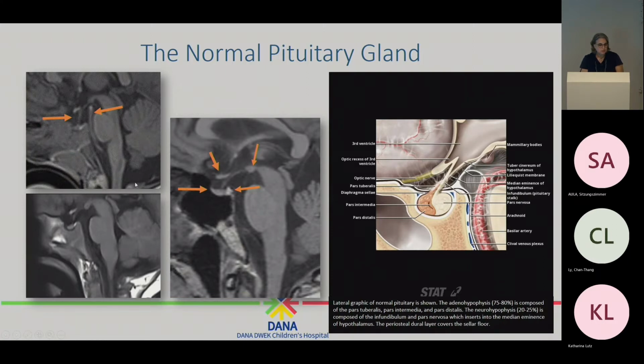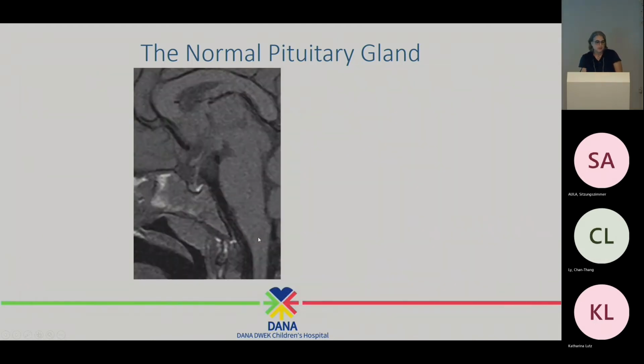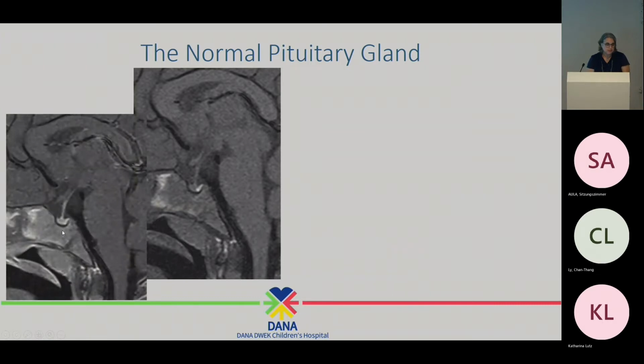And then we also look, of course, at the Sella itself, the sphenoid bone, which in children will be bony with red marrow. And then as development pursues, we start to get this high signal intensities on T1, which basically reflects fatty infiltration, pre-pneumatization process. And then the older children and adults, we have a nice pneumatized sphenoid sinus. When we give contrast, we actually lose the nice differentiation between the adeno and neurohypophysis, but we do get a better delineation of the stalk itself.